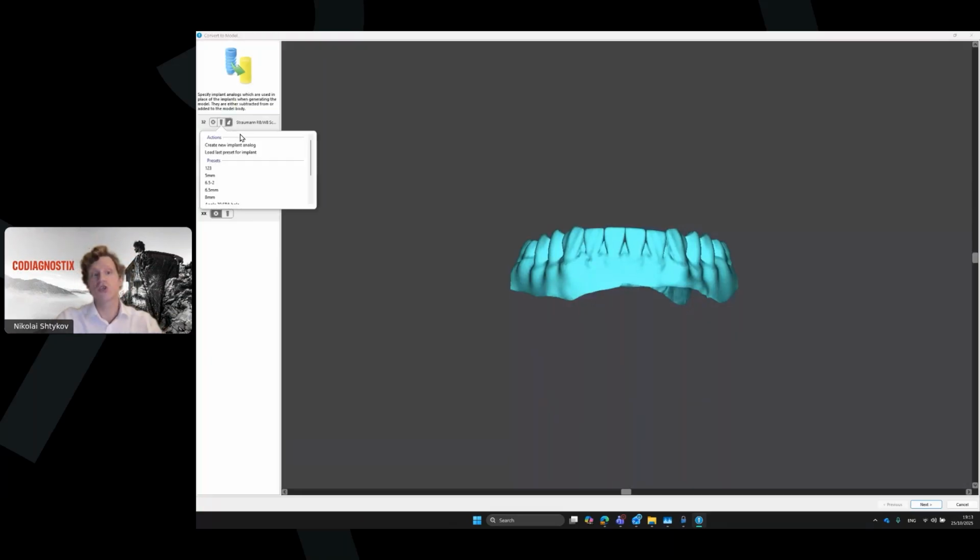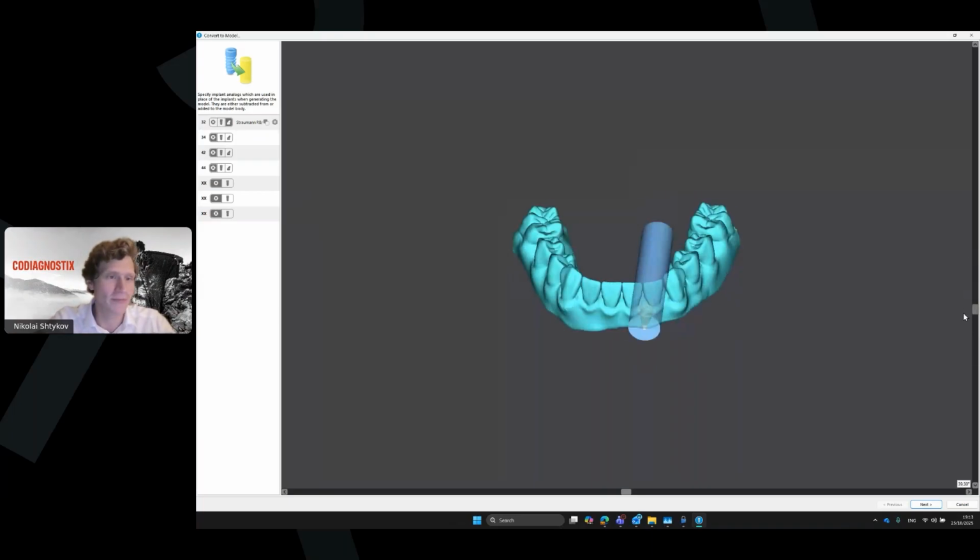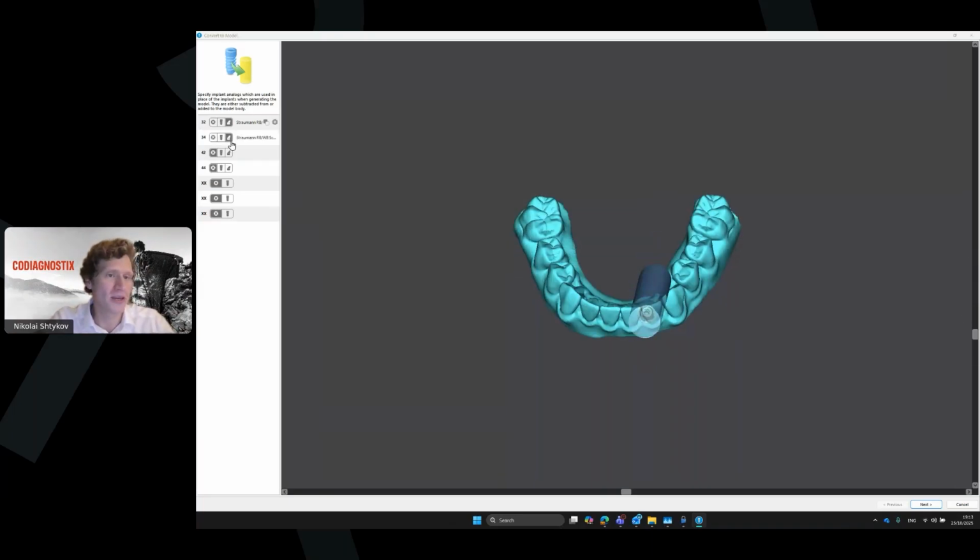And I also use, because I need to have in the future guide the big hole to understand where the cage will be, and to have access to the screw channel. And for this, I created a really big hole, 8 millimeters. So this is just diameter, 8 millimeters. If you don't like, you can create another one, maybe 10 millimeters, or maybe 5.